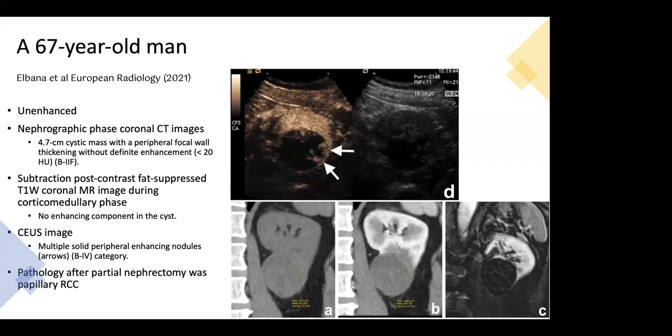And that is the beauty that is being claimed for contrast-enhanced ultrasound, that it picks up these subtle vascularity within the lesion more precisely with greater sensitivity.